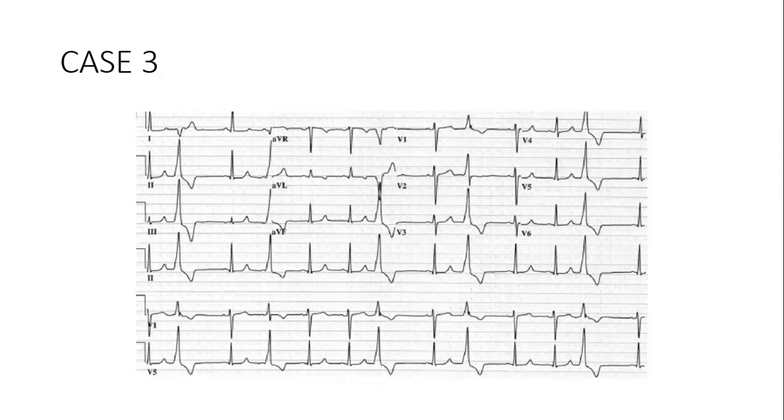Look in V5, there are P waves there, but small voltage. Look there in V6, there are P waves, but small voltage. Look there, V4. What is this? What do you call this?